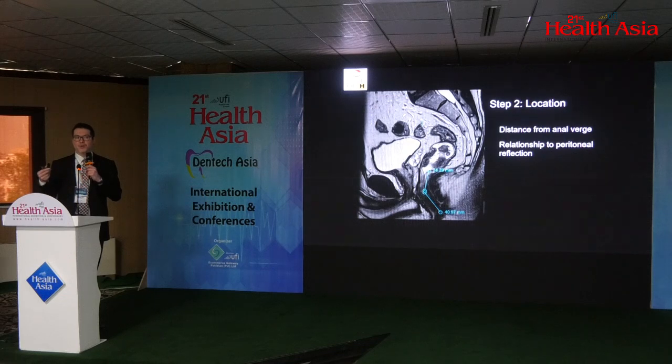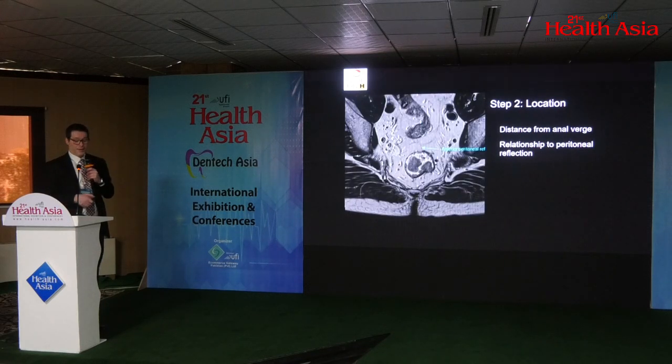You have to decide whether there should be an institutional agreement whether you measure from the internal sphincter or the external sphincter. But if you measure from the anal verge, usually the measurements are very similar. So it's important to measure it on a mid-sagittal plane that goes through the mid portion of the anal canal. Again, in the location, it is important to identify the location and its relationship to the peritoneal reflection. So this is very important to measure separately. We've discussed this previously as an anatomical landmark, but to explain this in the report is very important because this will decide the stage of the disease.